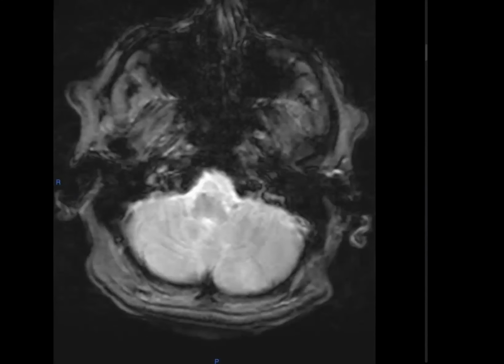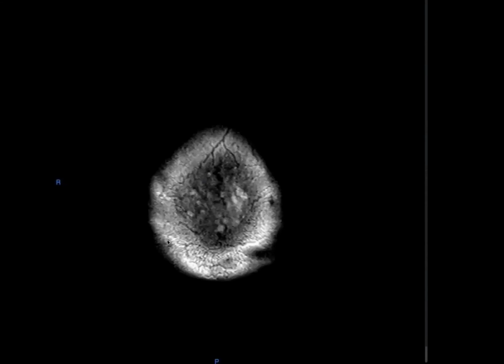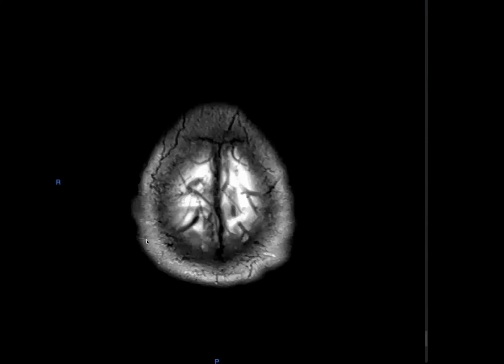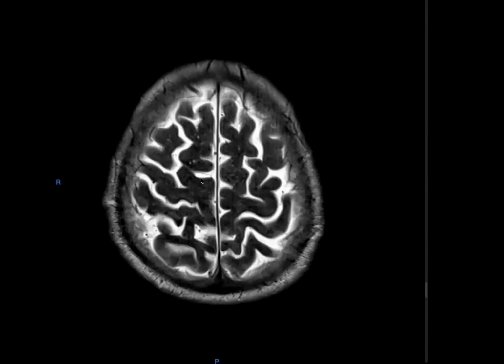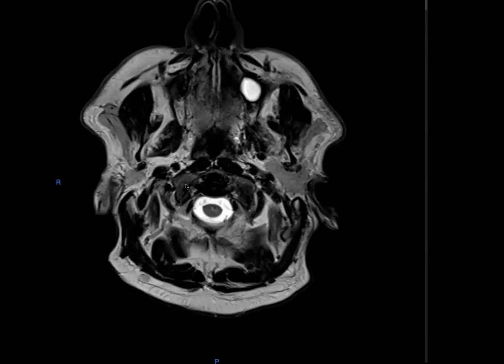And I know it's hard, but this is a fairly common way of them giving you something. So make sure you have a list of normal looking brain approach. And I remember when you were going through your T2 sequences, you said the venous sinuses look normal, but they were eventually found to be not normal. So be very careful and deliberate when you are saying something like this, that they are normal.